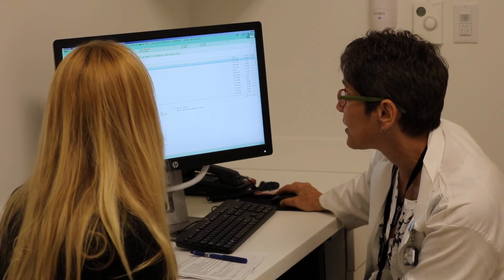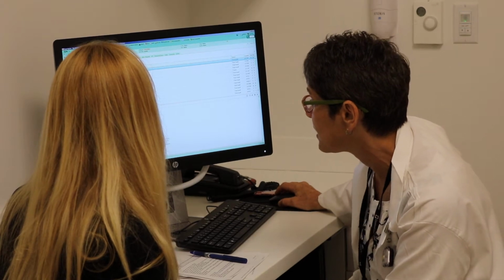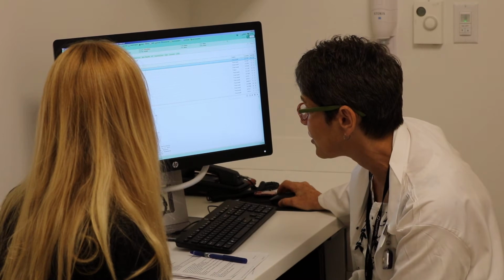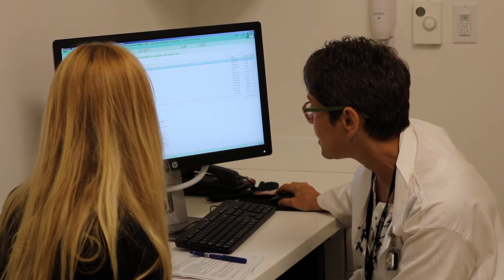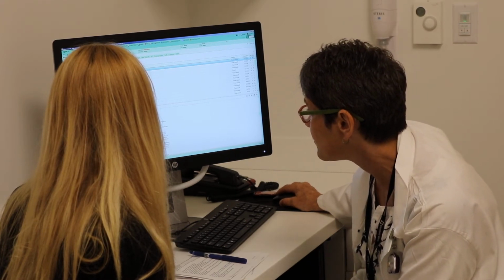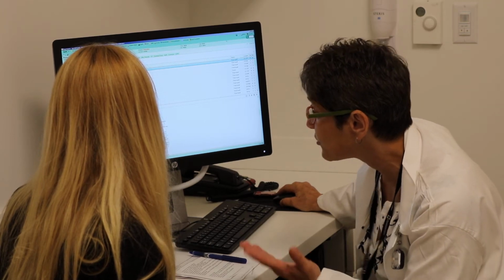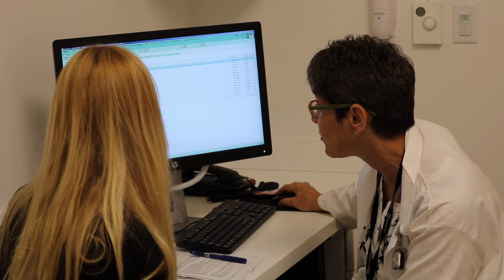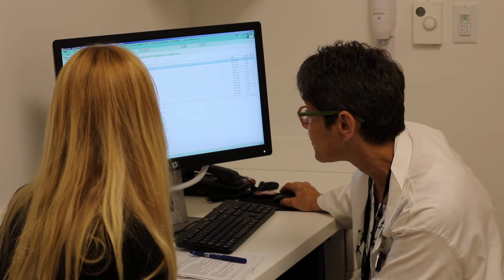Slightly progressed mass effect, so let me pull up the flare, I didn't pull that up. They thought it was slightly larger, but to me it looks kind of similar, to be honest with you. So 1.6, 1.2, 1.3, and if we pull this up next to older ones, it's going to look bigger because it's continually growing. So they're measuring this almost maybe about 3 millimeters.